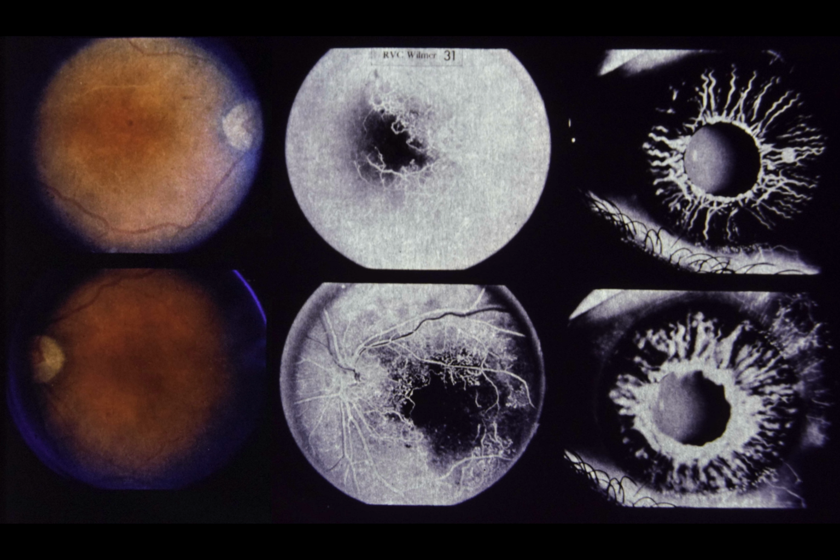Comment: extensive capillary closure has resulted in significant retinal ischemia, which has led to the development of disc neovascularization and iris neovascularization in this patient. Despite marked retinal non-perfusion in parafoveal capillaries, visual acuity was 20/20 in each eye.